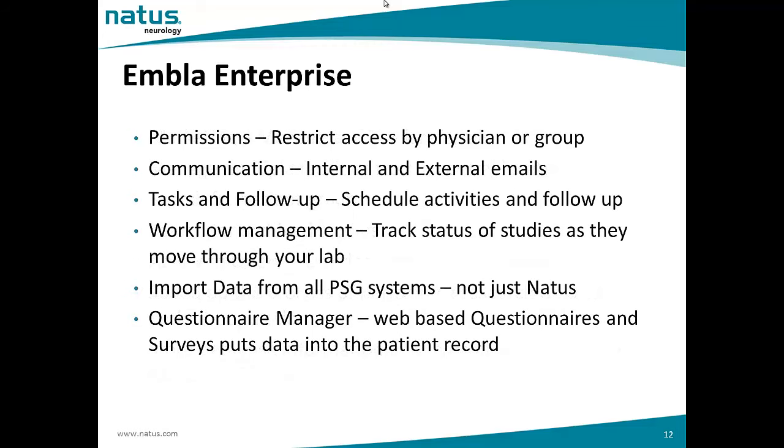In Enterprise, we can set permissions for people who access the database. We can set permissions by groups, like physicians, sleep techs, sleep lab manager, visiting doctors, secretaries, or clinic nurses.